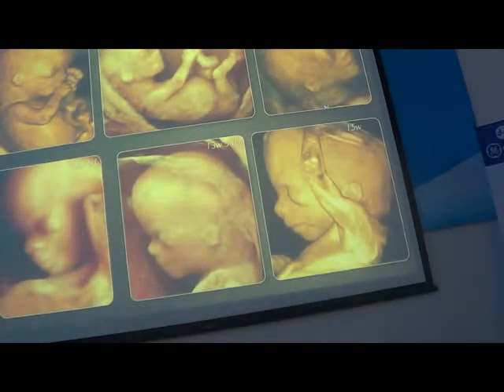And here are different aspects of the fetus during the first trimester of the pregnancy, from 11 weeks to 15 weeks. Here are images of the fetus from 11 weeks 5 days to 15 weeks. You can see it developing clearly, with a normal position of the ears, in a low position at this stage.